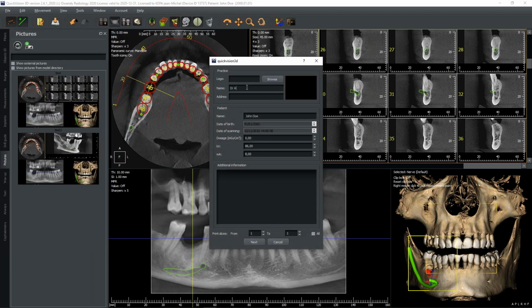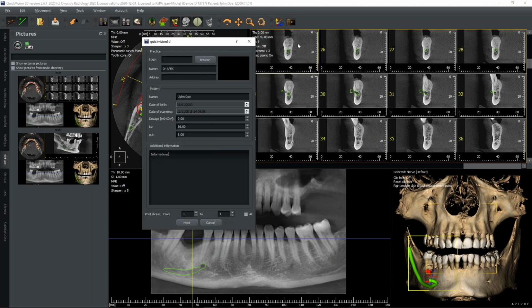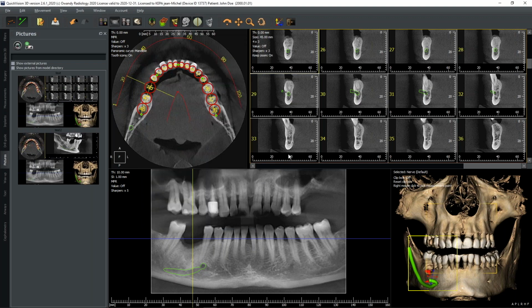I may give a name, address, additional information, and I select the number of views, means from 25 to 36 this time. And now I'm creating my report.